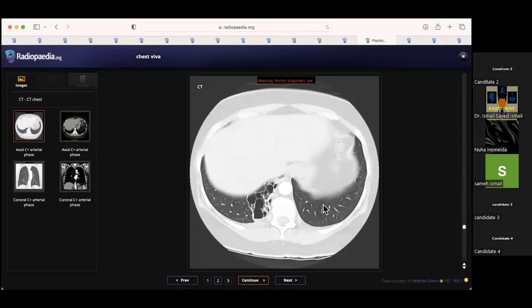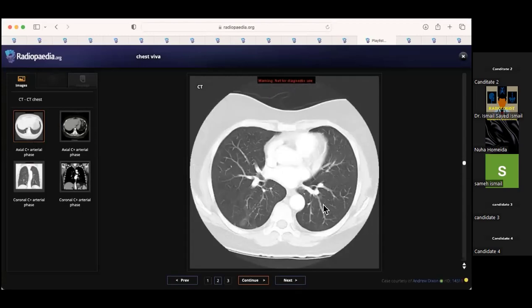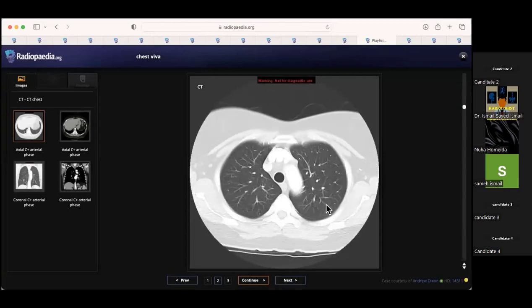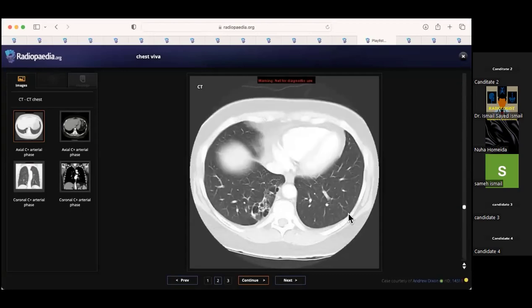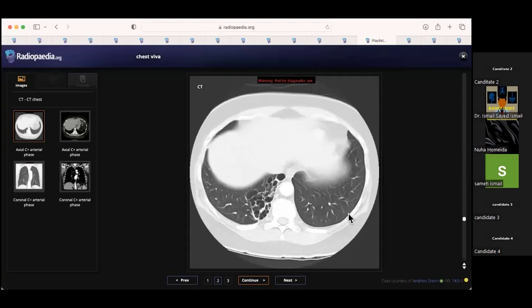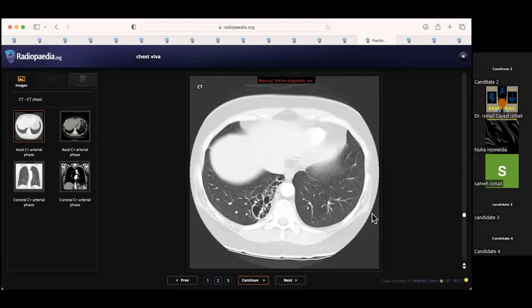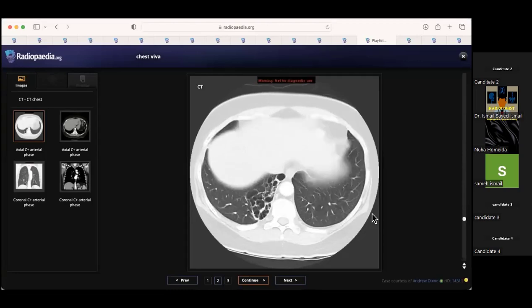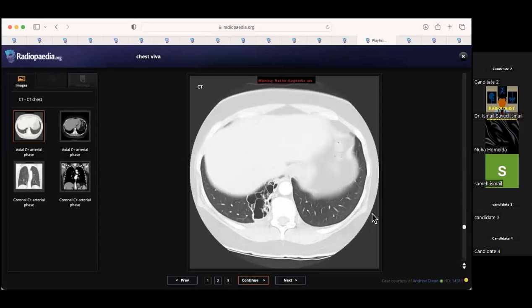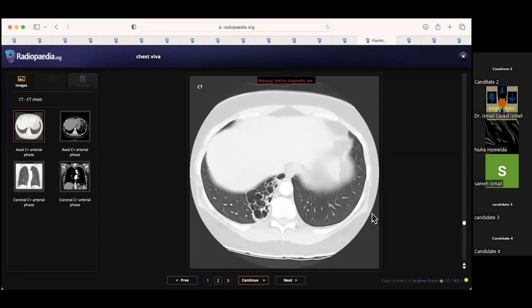Okay, in this lung window, I will go briefly to the top of the study. The main abnormality I can appreciate is multiple honeycombing areas noted in the medial aspect of the right lower lung lobe. The rest of the lung. Sorry to interrupt. Honeycombing, what do you mean by honeycombing? Can you see honeycombing here? Yes, it looks like honeycombing, but it seems large in size.